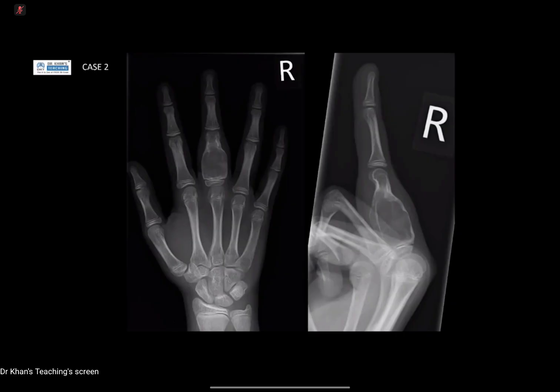Yeah. And so would you be saying this is aggressive, non-aggressive? Would you be suggesting anything else? So it is a lytic lesion, and since there is no periosteal reaction or soft tissue abnormality on the particular radiograph, I won't be able to comment. I would suggest cross-sectional imaging, particularly an MR of the lesion, to comment upon it. You would suggest it? I'm really sorry, you keep cutting out. Yeah, a cross-sectional MR, to comment upon its aggressiveness and any further involvement of other structures.